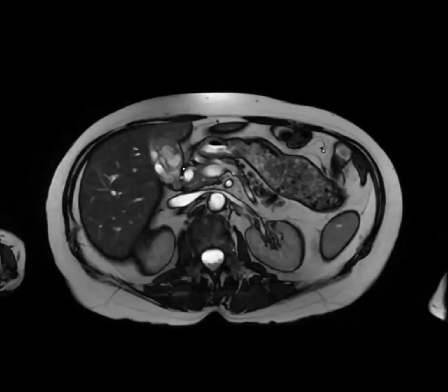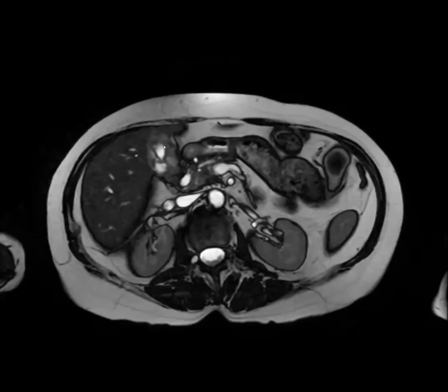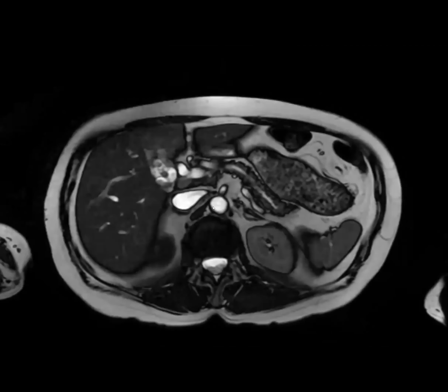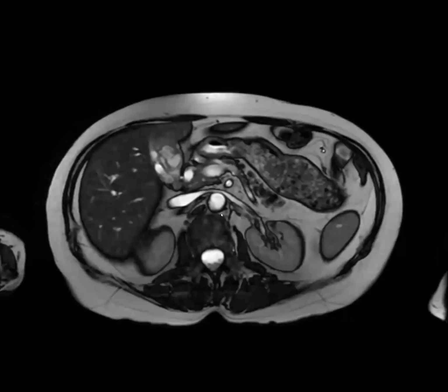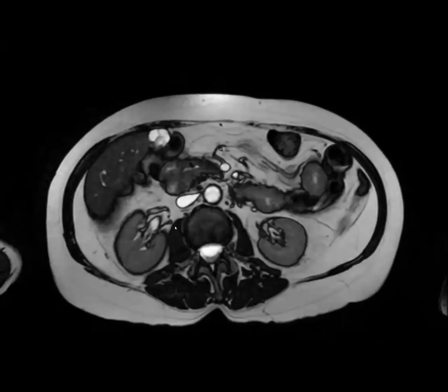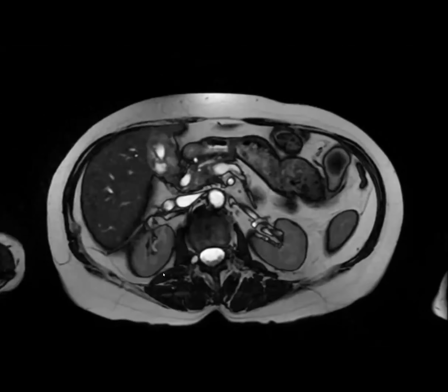I'll show you. Oh, this is the true FISP. So you can see that was the adenomyomatosis, but even where the wall is kind of thick, there are all these other weird cystic spaces now. It's not gallbladder cancer. Anything else come to mind? Contained perf? Great thought. It was not that. The lumen is pretty, but contained perf was a great thought.